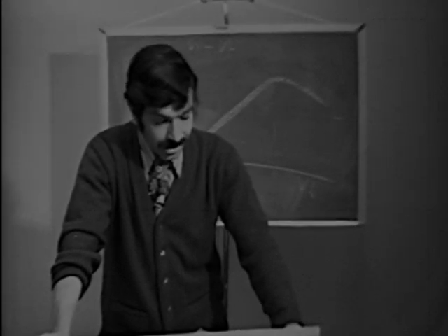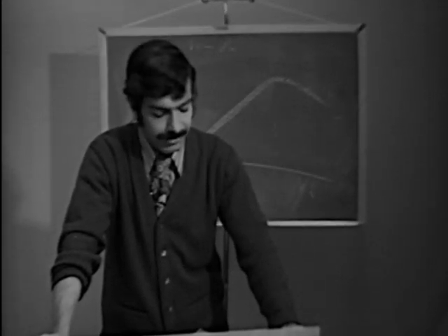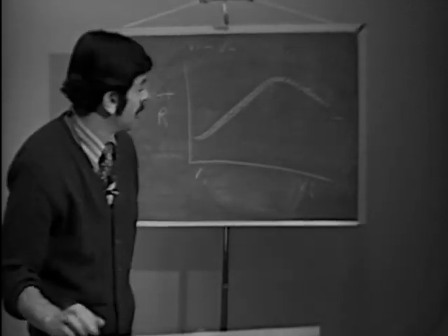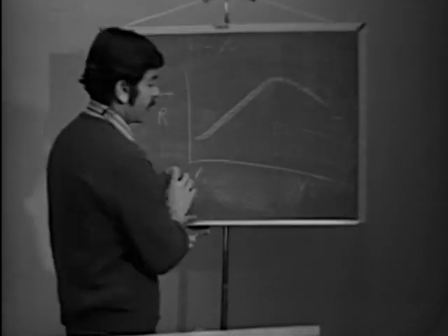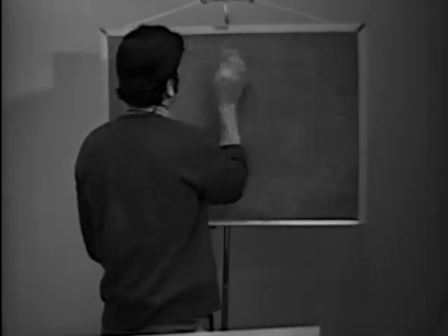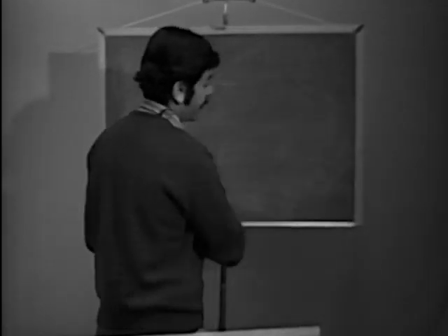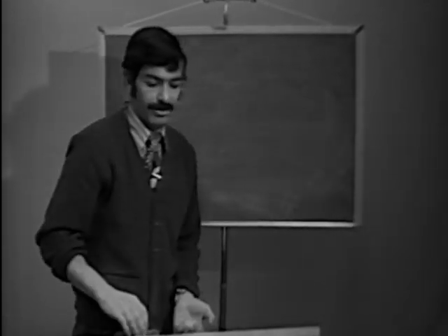Okay, well there's just a few other things here that I'd like to cover before we finish. And one of them is T waves. And the second thing is position and rotation of the heart.